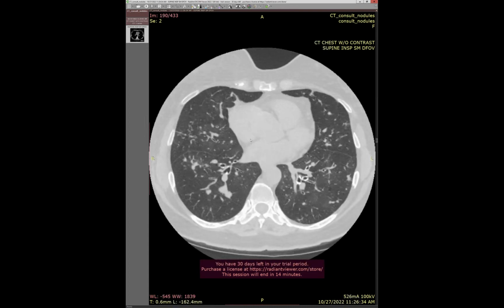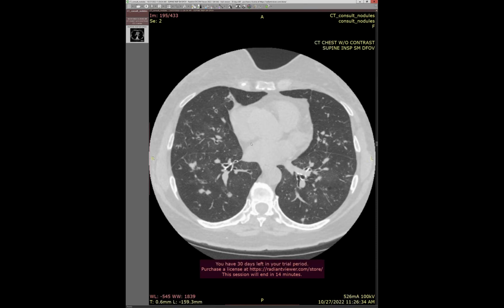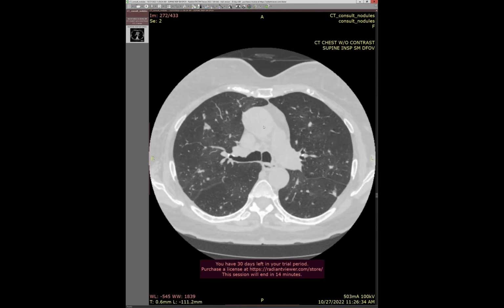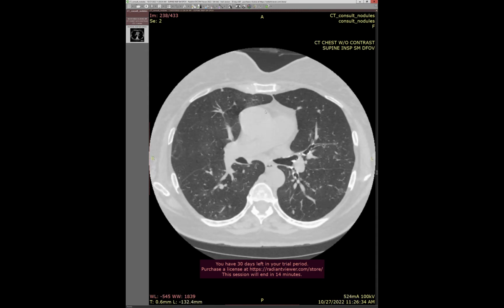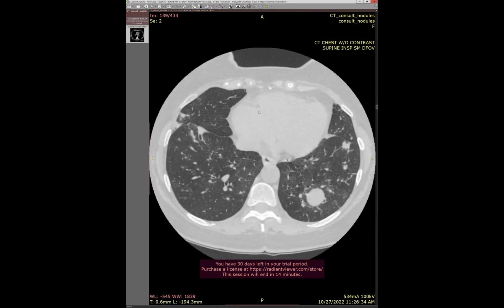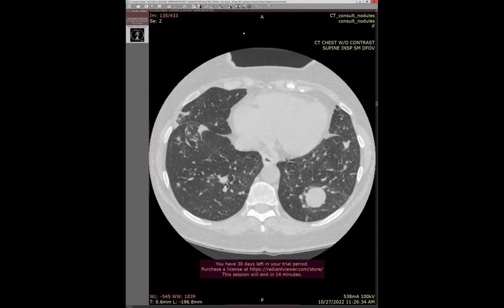And I think I showed this to the group. I sent it out as a consult, and I think everyone wasn't sure, but a lot of people said they thought it was probably going to be DIPNECH because of the nodules and mosaicism. But the other thing that was atypical is that she developed asthma in her 20s. So she wasn't the 50-year-old with adult onset asthma. I guess 20s is still adult, but it's usually not the classic 50-year-old. And yeah, I'm still not sure what it is.